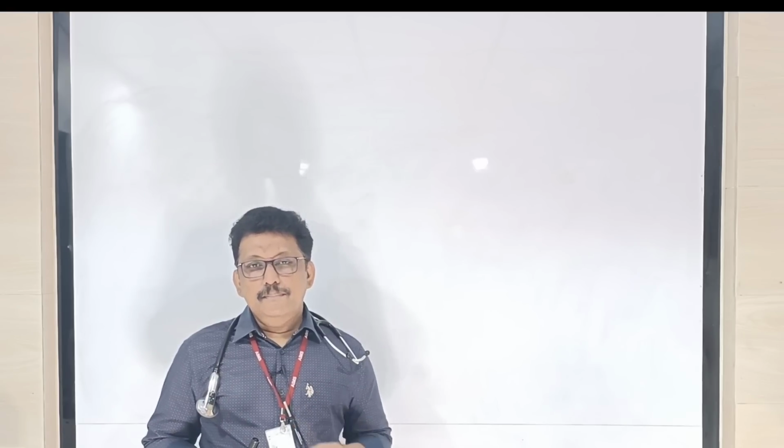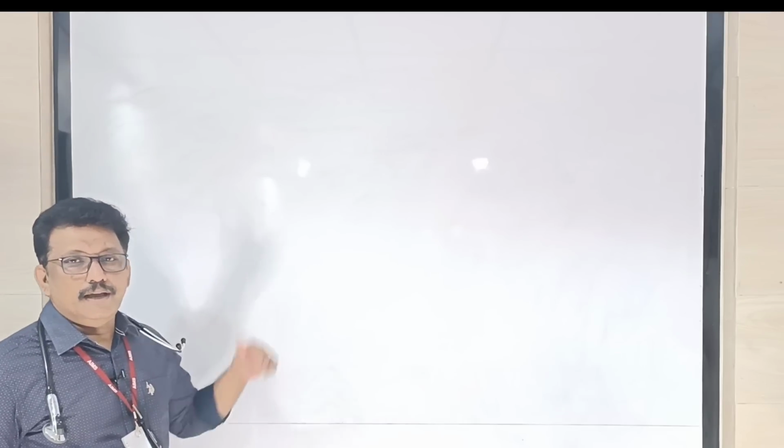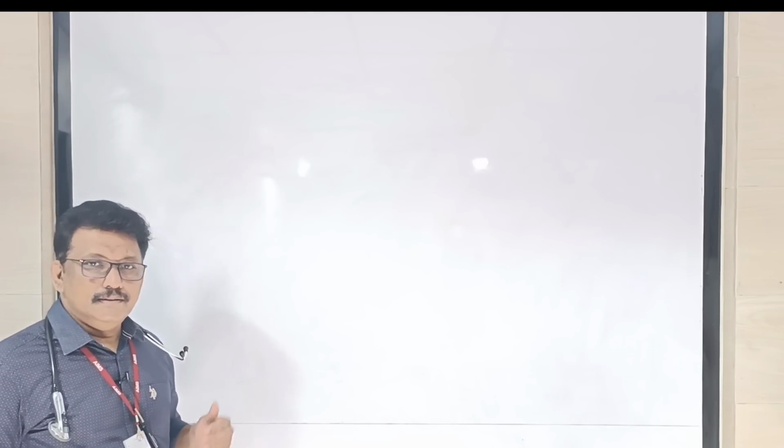Today we are discussing ST segment elevation and ST segment depression. However, we will be talking about acute myocardial infarction changes also. So we'll see how to diagnose MI in ECG now.